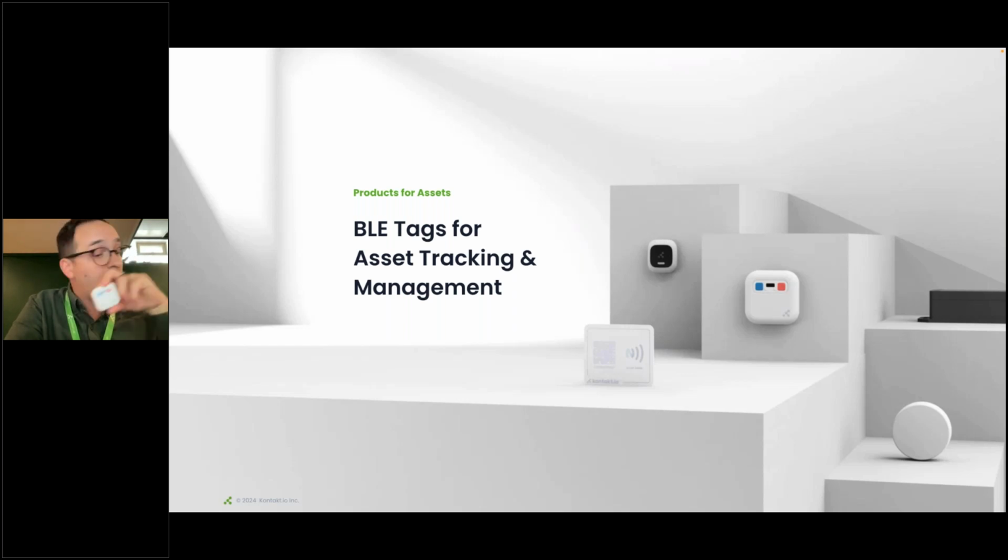It's a little large, but it also has 2 programmable buttons on it, which we'll get into a little bit later, but it allows you to automate a few workflows or trigger some really fast workflows. I'll just tell you now. When this bed is broken, just press the red button. We'll automatically open a ticket that says this bariatric bed is down, it needs service, and it's located here. And you'll also receive that updated location if it happens to move. So now you've got a ticket open for it. You're not going to stumble over it later realizing, why didn't anybody tell me about this?